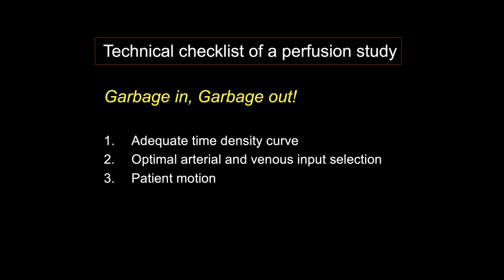This is a very famous radiology quote. Garbage in is equal to garbage out. What does that mean? Before you start looking at the summary maps, or before you even think about using the summary maps for decision making, one of the pivotal things to do is check the technique. So I like to have a technical checklist of a perfusion study before I go into the summary maps and understand the volumes, and to ask myself, do I believe those volumes?